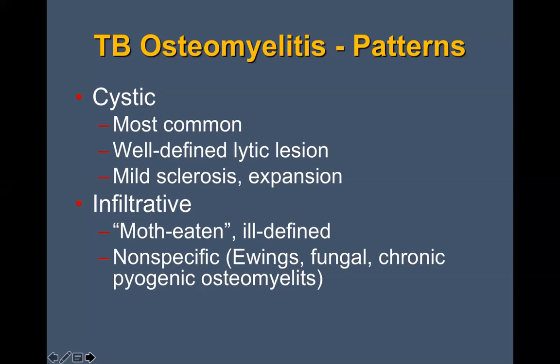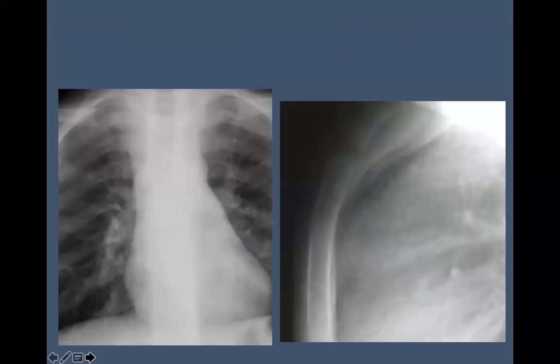So that can be very confusing if you have that type of tuberculous bone involvement. And then the dactylitis that we know as spina ventosa, of course, we tend to see that in young children, and that's a fairly characteristic pattern for TB.